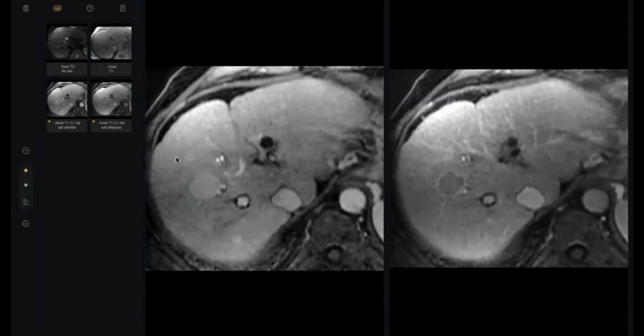According to Radiopaedia, what happened here? Tell me, please. The lesion is taking up contrast. What is the degree of contrast uptake? This is one of the most important criteria in the liver. We should tell what type of contrast uptake is here.